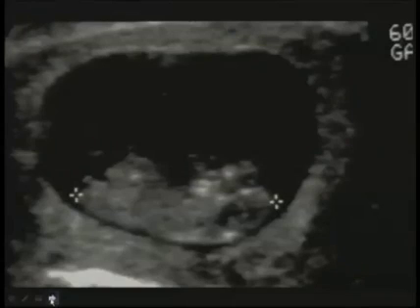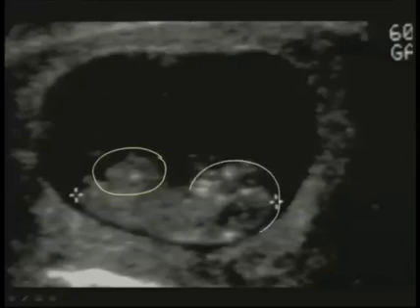Here's an example of mid-gut herniation into the base of the cord right here. This, of course, is the embryonic head. This is the thorax. And there is the herniation into the base of the cord. If this fails to retract back into the abdomen, it would constitute an omphalocele, but at this early stage, it is not possible to tell the difference. And the diagnosis really needs to be deferred till 12 or 14 weeks.